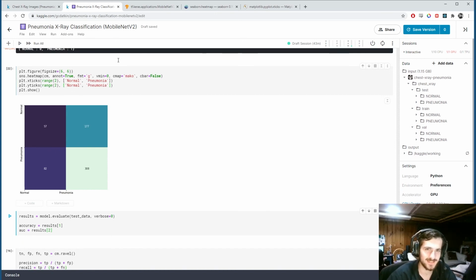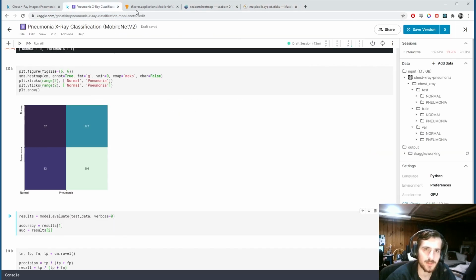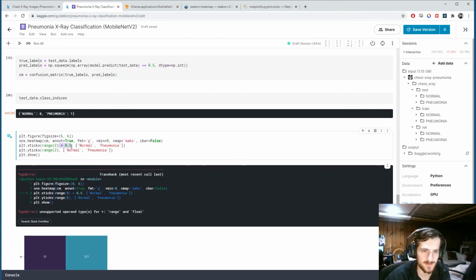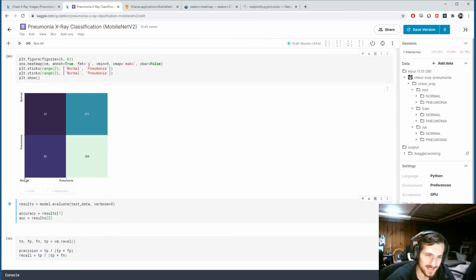Close enough, right? Come on, there has to be something better. How do we get it in the middle? Oh, hold on. Can I do plus 0.5? Yeah, that did not work. Oh man, see, because it's doing 0 and 1 directly on the corner. Yeah, let me get it right.